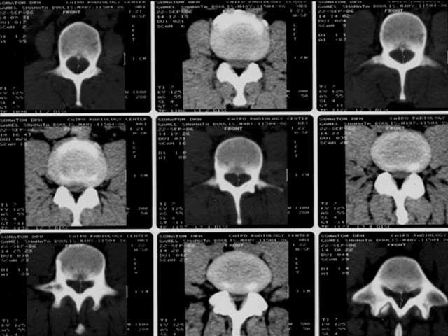This question is very important because if you say this is a bony structure, you should go for the bone window images for evaluation. If you decided that the canal is soft, then you go to the soft tissue images for evaluation. But you know that the canal is bony, and then you should evaluate the canal in the bone window images. How can you evaluate the canal? You measure the diameter from anterior to posterior, then the machine will write a number here. And this is the dimension of the spinal canal.